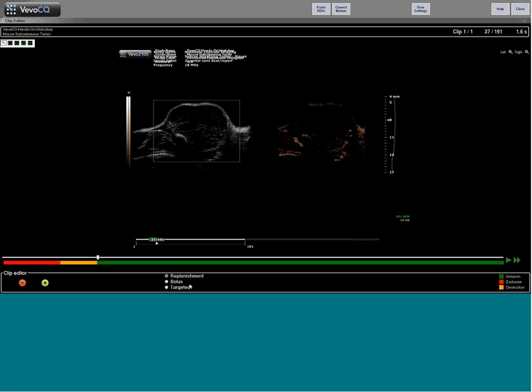So I'll actually cancel on this one because I want to show you the difference here in the main screen. Now, in the original first ones that we pulled in, bolus was already selected, and we can actually select bolus if we want to.